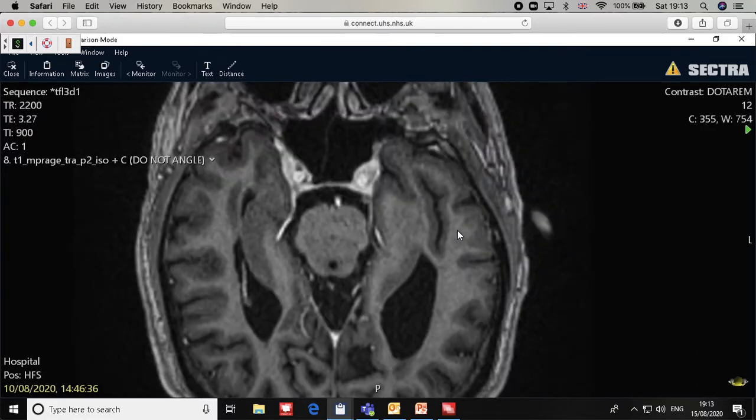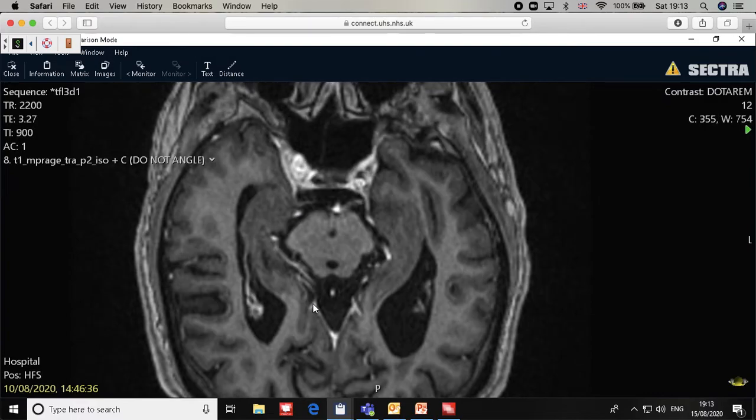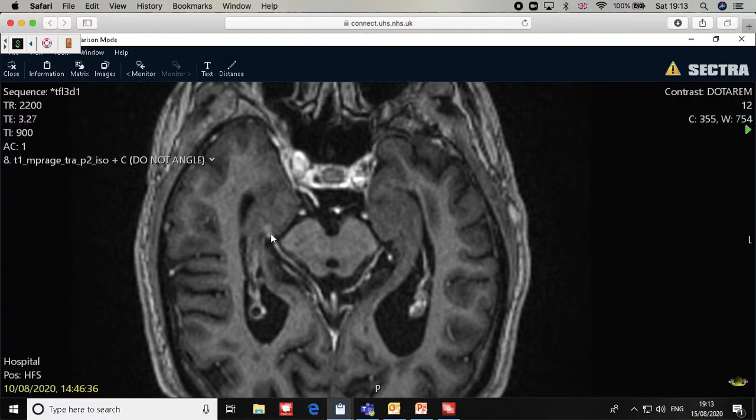Okay, and so familiarize your eye with the lateral horn, and then any gray matter inside will be the hippocampus. You just follow the hippocampus, gray here, gray there, just draw it, and you will end up with a very nice looking structure, the hippocampus. And if you look at it in the sagittal view, you'll see that it has a body, a head, and a tail.